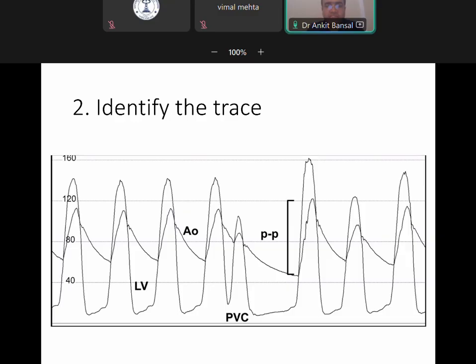Okay, identify this trace. I have already given the hint. So very simple trace, no answers. Sarthak Gureja, Brockenbrough phenomena. So that is the problem.